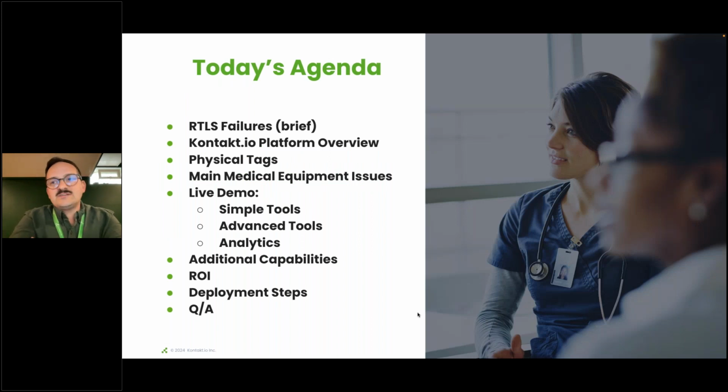Our agenda for today is going to be all things medical equipment. I'm going to start off with a brief recap of things we've talked about in the past regarding the failures of RTLS. I'll keep it brief, have no fear there. And then I want to get a good understanding of the lay of the land when it comes to our platform and what infrastructure might be required, what cloud deployment looks like. This won't take too long.